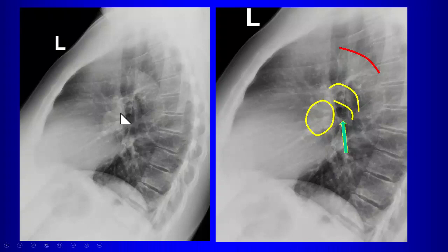So let's move on to the lateral view, the things that we need to know. Here on the lateral view, this guy over here, what is it? It's the main and right pulmonary artery superimposed on the lateral view. That's called the right hilar vascular complex because there can also be some veins over there, but most of it is the main and the right pulmonary artery.